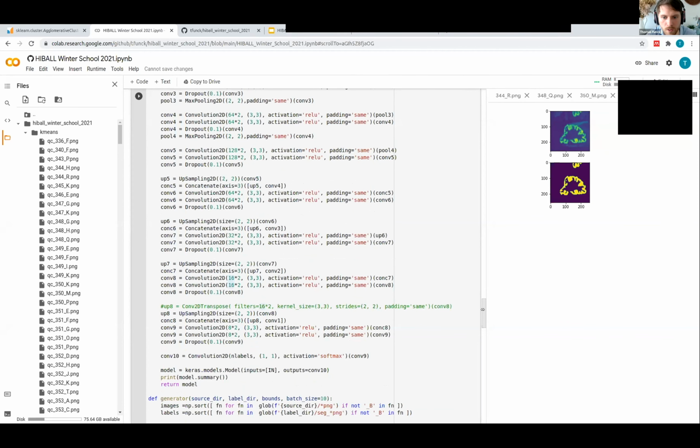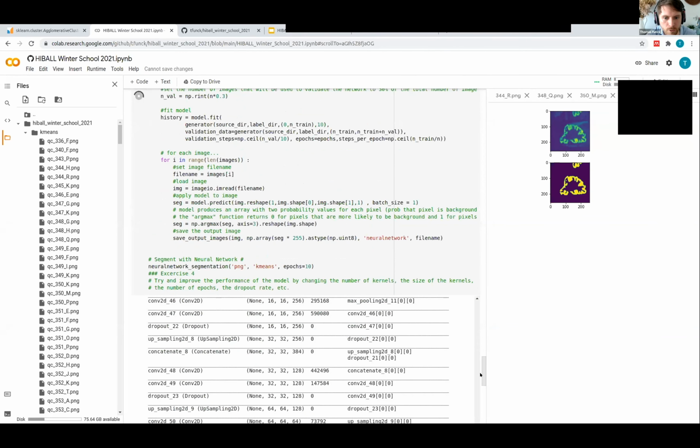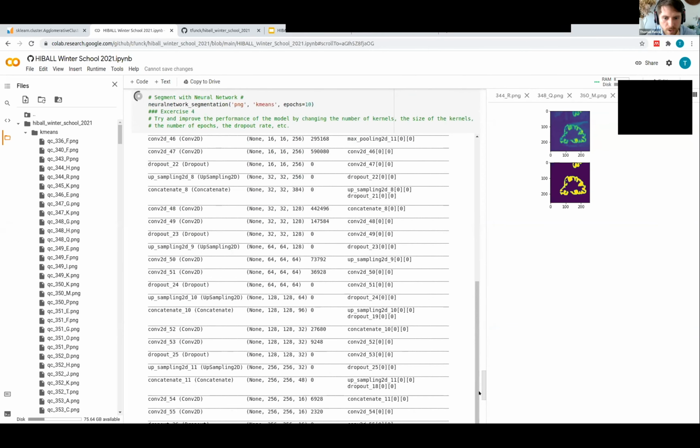So you guys can start playing around now, and I'll tinker around a little bit on my own, and explain what's going on for people who aren't tinkering.